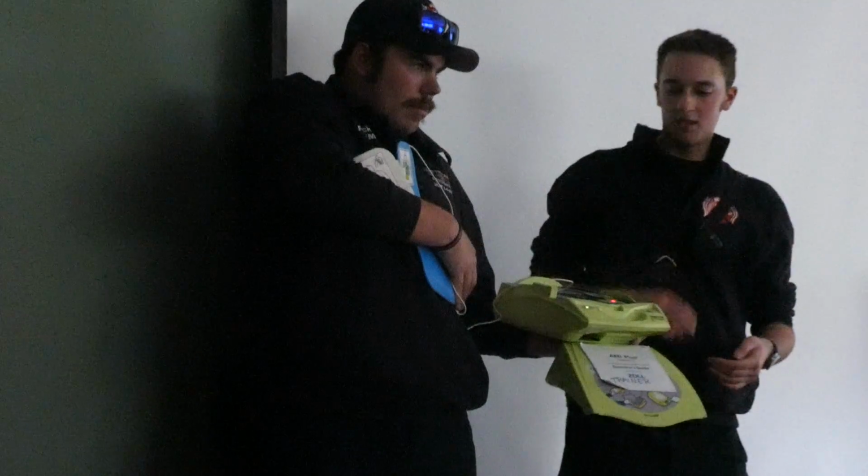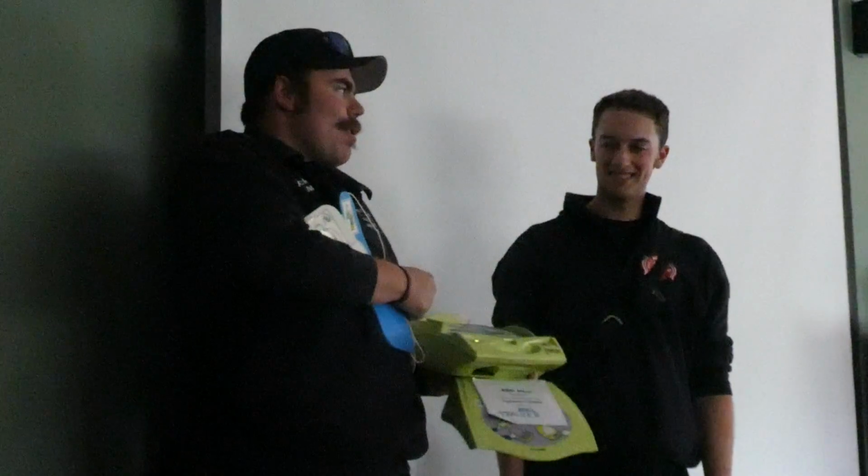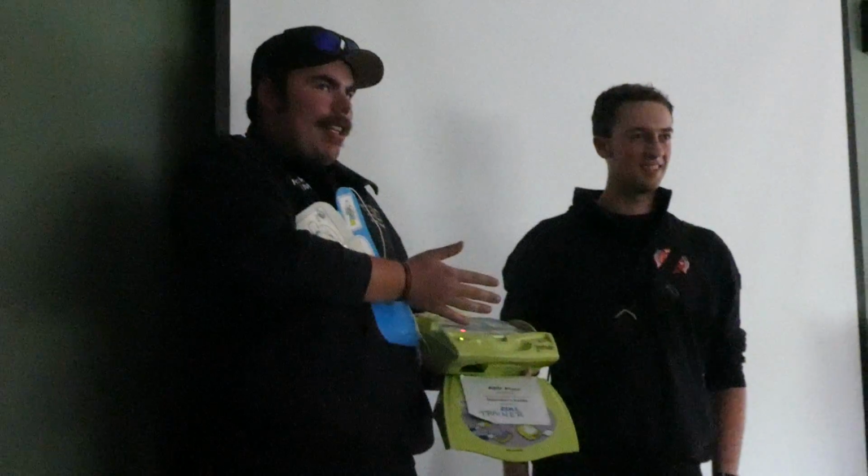Shock will be delivered in 3, 2, 1. All right. So this is a demo one, based on what the remote tells it to do. So these are pretty much, I don't want to say idiot proof, but they're pretty much idiot proof. They're very self-explanatory. They walk you through it.